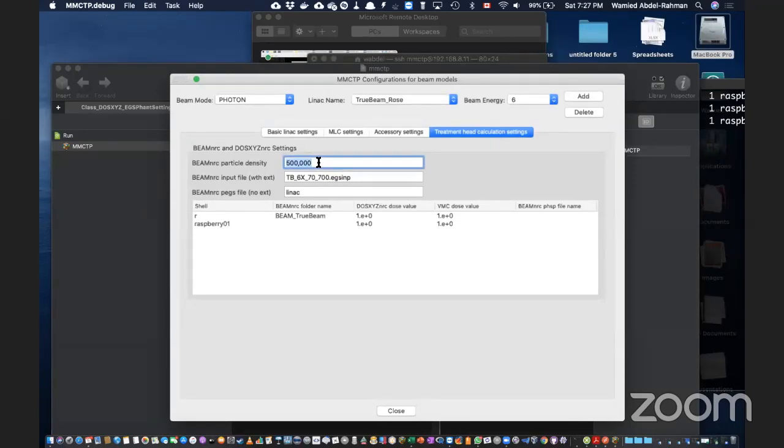This value, you can change it. You can say, look, I don't want this density. Probably 10,000 is going to be fine. I'm happy with that. It's up to you, okay? But it's a value that they have.